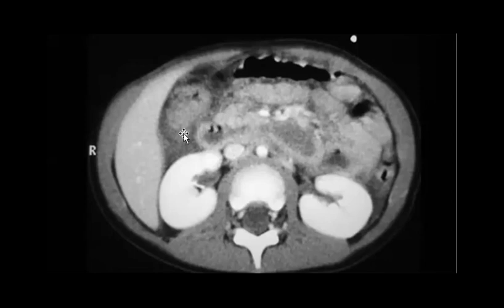So also, if you go to the pouches, when you are in the ultrasound and you go to check for them, you can find some fluids. So this means that there is injury in the hepatorenal pouch or in the lienorenal or paracolic, left paracolic gutter, right? Perfect. Yes. Okay.